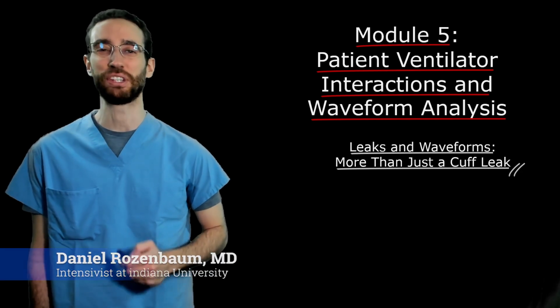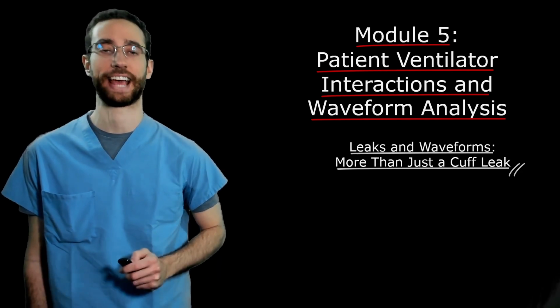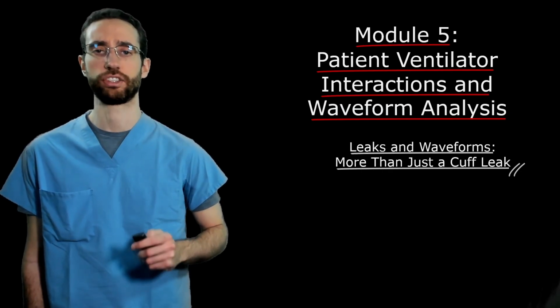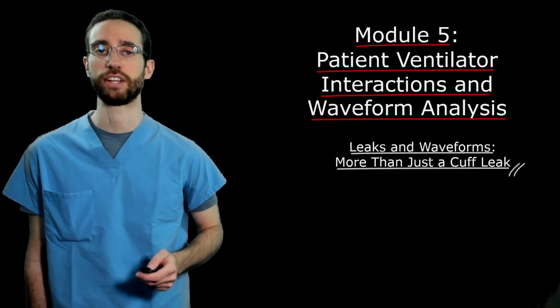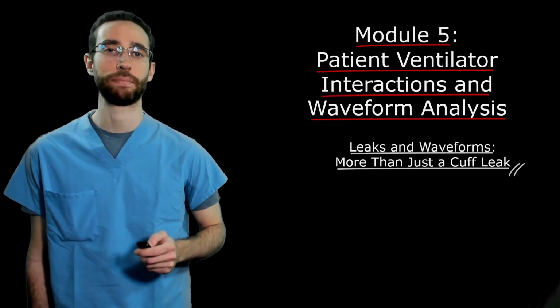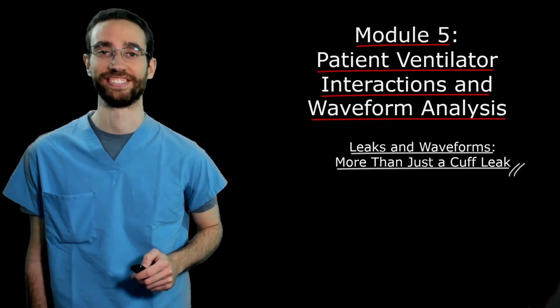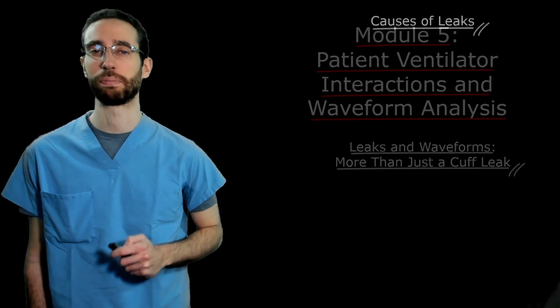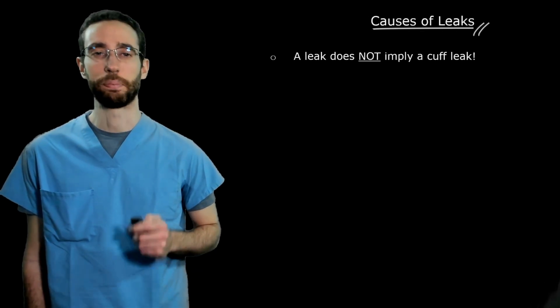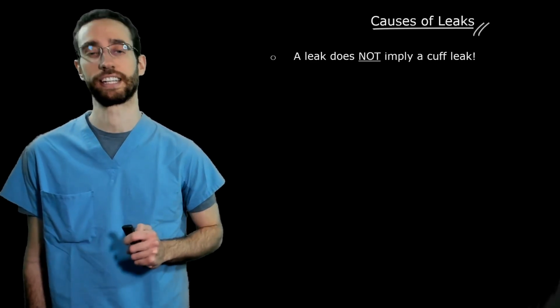Hi, today we'll discuss circuit leaks, focusing on the multiple ways that we can detect them. A circuit leak is the generic term describing a situation in which some of the gas delivered by the ventilator escapes from the system, hence not returning back to the ventilator. I'd like to start with an important clinical point. The presence of a leak does not equal a cuff leak.